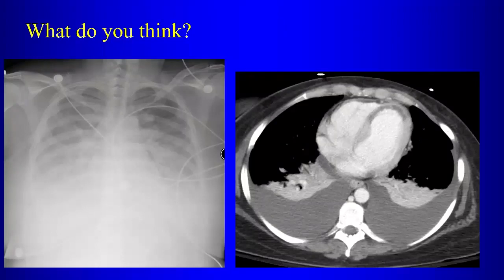All right, so, this person shows up in the emergency room, short of breath. The chest x-ray looks like that on the left, and they get a CT scan for pulmonary embolism because they're short of breath. So first, what's abnormal on the chest radiograph? It's very whited out near the lung bases. Yeah, and it turns out that that represents what? Very large pleural effusions. Now there are these areas of atelectasis also that are contributing to the opacity.